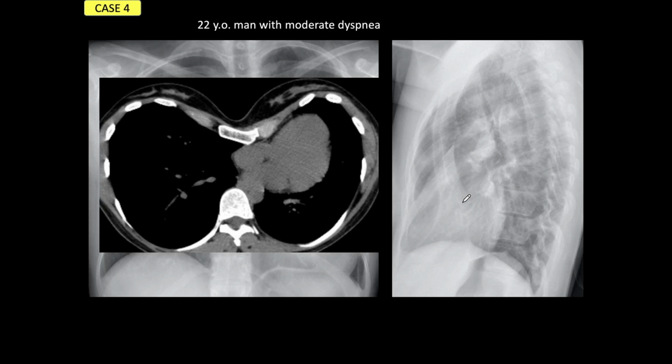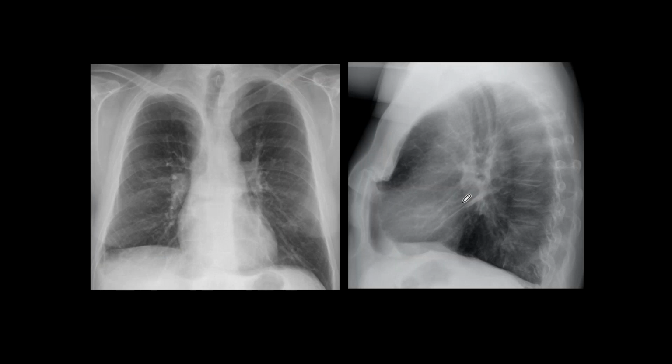And I'm presenting this case because I want to talk about the sternum. This is the most common abnormality of the sternum that you see quite often, and most of the time you need a lateral to diagnose it. And the rest of the sternal diseases are very difficult to see: in the PA you don't see the sternum at all, and on the lateral view, many times it's very difficult to see discrete lesions of the sternum. You can see the trauma, and you can see, as in this case, a marked decalage of the sternum.